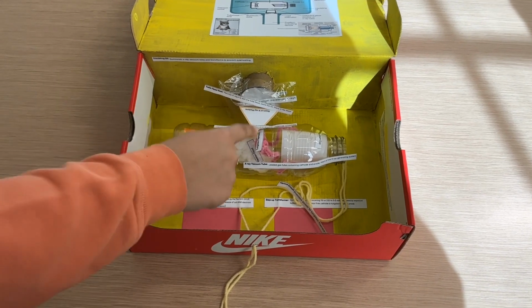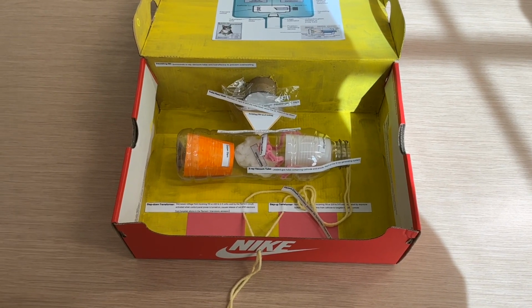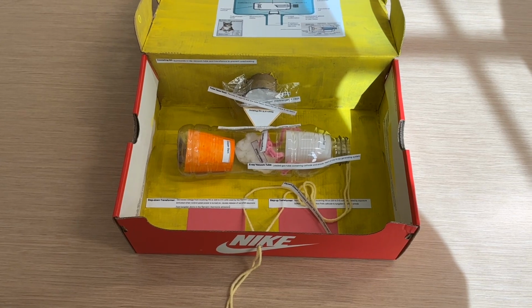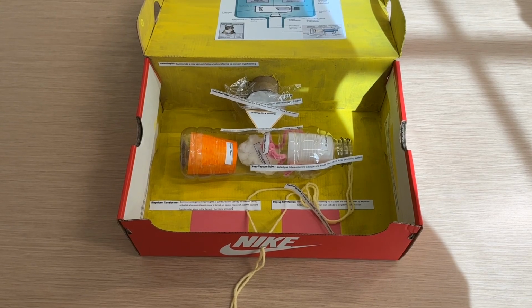We also have the tungsten filament, which is right here, which provides electrons when it's heated. The electron cloud is a mass of free electrons that hover around a filament wire when it's heated to incandescence, and the number of free electrons increases as the milliamperage increases.